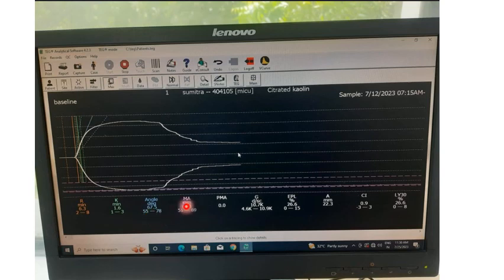Now come to the maximum amplitude. The maximum amplitude is 68, and 51 to 69 is normal, so the maximum amplitude is also normal. Now come to the 30-minute lysis. 0 to 8 is normal, and this is 26. So more lysis is going on.